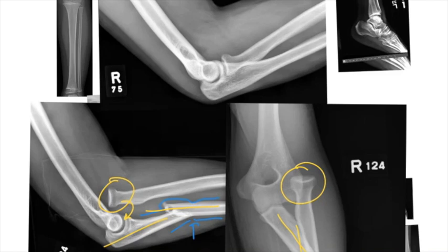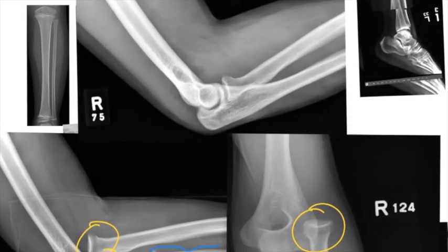Sometimes, however, it's not so easy. So if you take a look at this elbow up top, everything looks pretty good. And for a radiologist, making the diagnosis of a radial head fracture can be pretty tough. But as a clinician, you actually have an advantage that we do not. You have the patient in front of you. So we might notice that while this looks pretty smooth, there's a slight little bend here which makes us a little nervous. There's a slight little lucency here which we may or may not know what to make of. But there is also a joint effusion. And when we see that, we're going to be very suspicious in an adult of a radial head fracture.